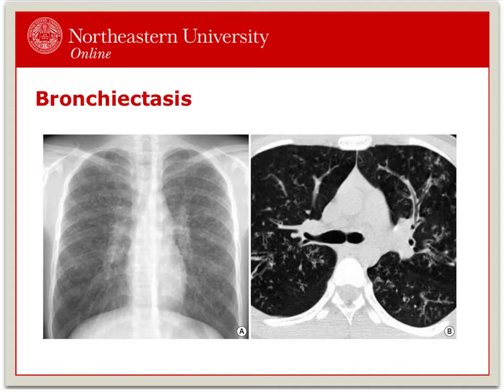Bronchiectasis is a form of COPD which also includes emphysema and chronic bronchitis. This causes thickening of the airways and dilation. On the axial CT scan imaging, we see thickening of the airways, and they're more dilated, so they're more prominent, allowing the air to try to flow through. We also see some plugging of these airways.